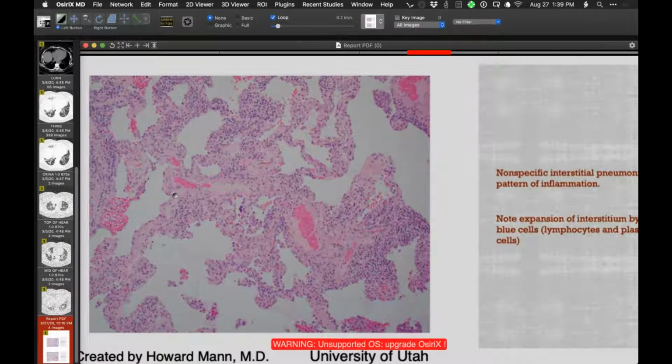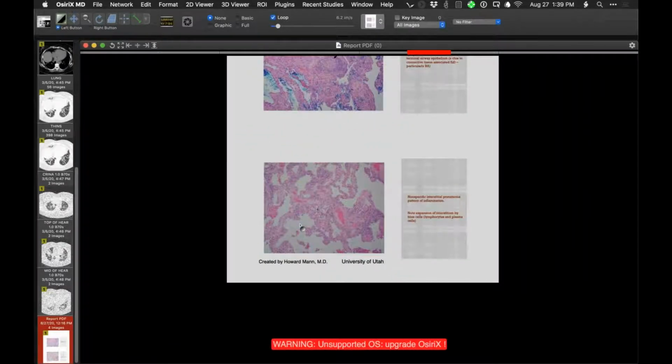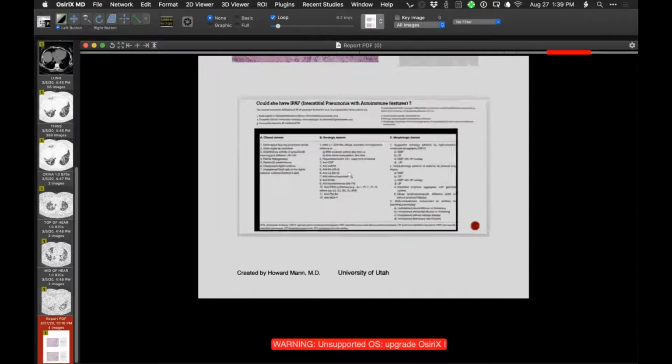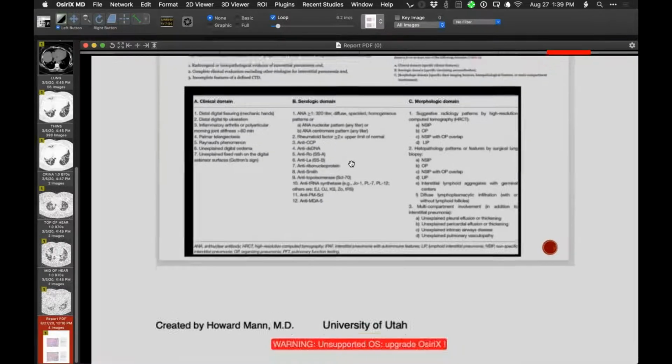So the combination of pleural disease, this pathology, and the lymphoid follicles is, for a pathologist, very distinctive for connective tissue disease associated lung disease. So that is the diagnosis. And of course, because of this presentation, we certainly should wonder about, you know, this notion of IPAF in part.